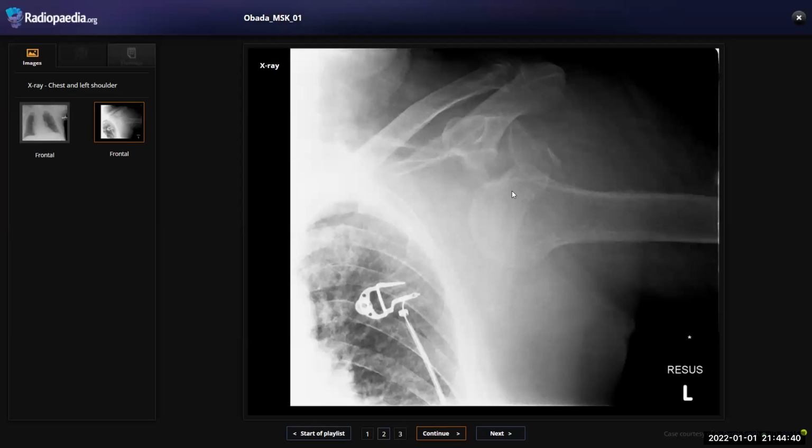Okay. Just I want to ask you if you have heard of an inferior dislocation. Yes. The inferior dislocation is a very rare dislocation. But can you convince me this is an inferior dislocation rather than an anterior dislocation? Yes, it is prominently inferior dislocation, but normally along with inferior dislocation, there is some anterior displacement also. So it is normally associated with that. So I also mentioned both. Okay. But it is predominantly inferior dislocation. Right.